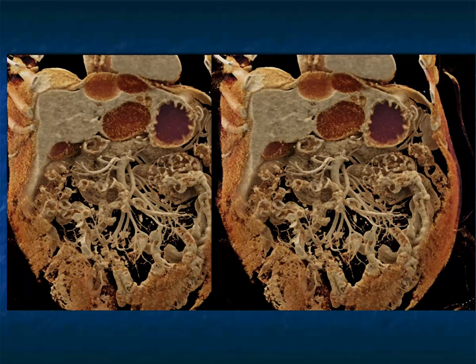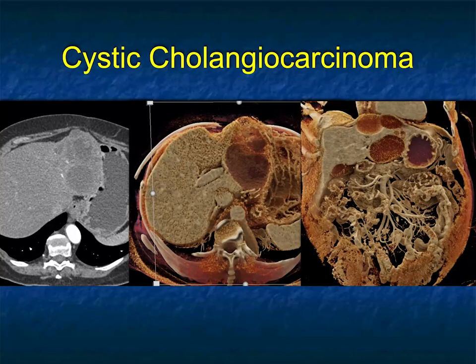This was a very unusual case. My differential would have focused on a malignancy, possibly hepatoma, hepatic adenoma perhaps, but something else to think about is cholangiocarcinoma. When we say cholangiocarcinomas, we typically think about dilated intrahepatic ducts, but cholangiocarcinomas can be solid infiltrating lesions. They can cause duct dilatation.